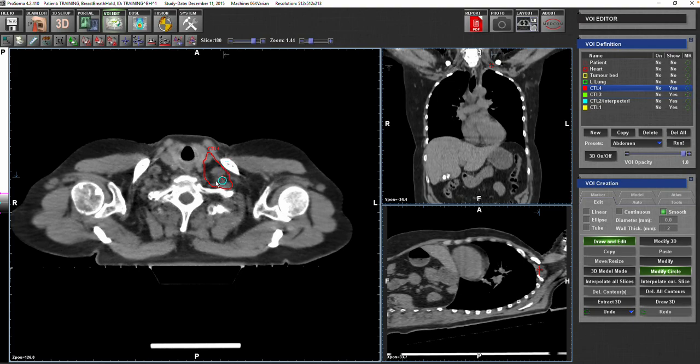I mean, it doesn't matter honestly whether you do it like that or you don't take the posterior to the artery, but I would cover the artery properly, especially when working without any contrast. If you can see the contrast, it will be very easy for you to delineate the artery and the coverage and to cover it properly. So scalene muscle, internal jugular vein, cover the artery, and that's it.